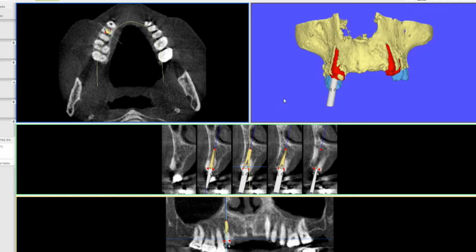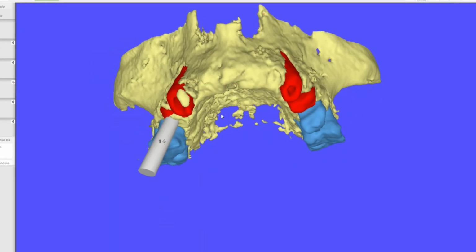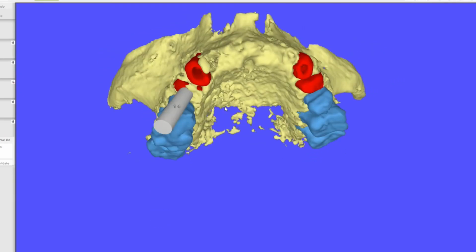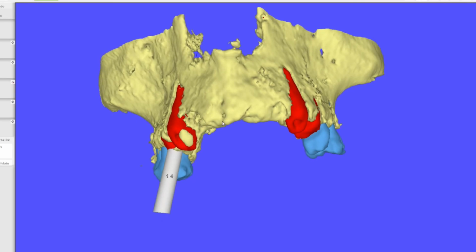So yes, this is looking quite nice. We can now click onto here and say, oh well, this isn't looking too bad, but of course our crowns aren't clearly shown. We don't know if that is actually going to be where we want it in terms of our restoration.